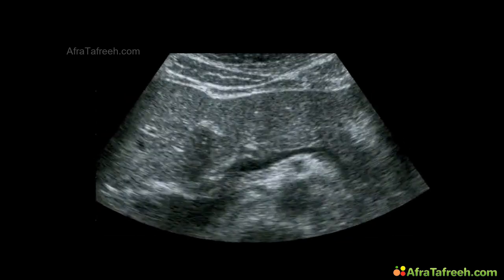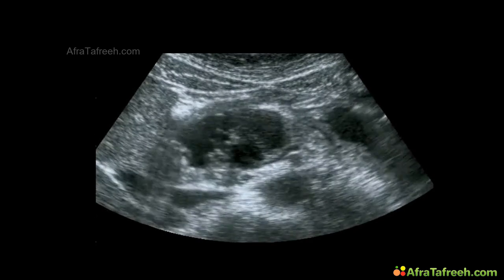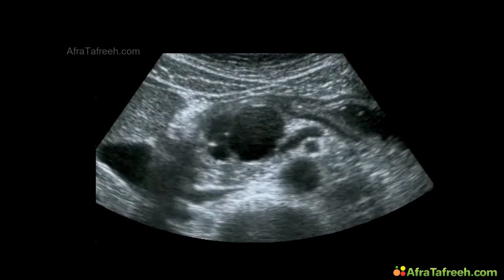In some cases, it's possible to wait and see what's happening. In other cases, we have to take a puncture or do an operation. But this is very hot stuff, and I will only discuss the cases where it's easy to make a diagnosis. For instance, in the next case.